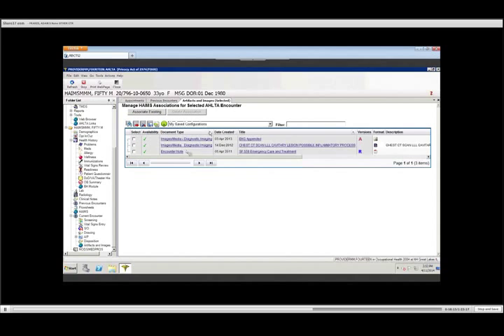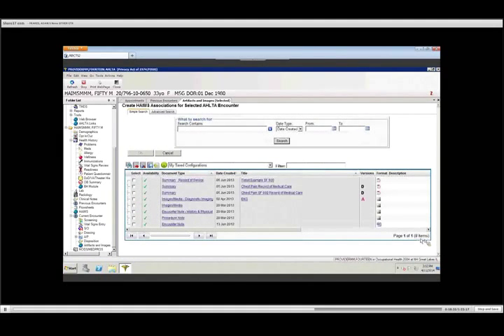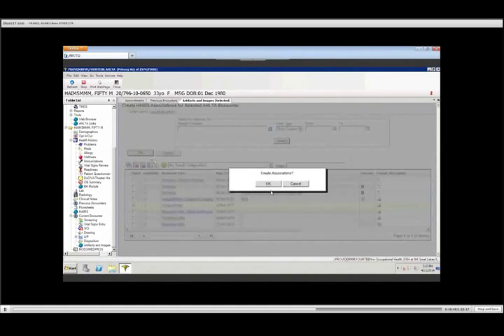So you'll notice we have 3. Again, the process is the same. I click on Associate. Now before I do this, we have 3 assets that are associated to this previous encounter. When I click on Associate to go and associate another one, do you recall how many assets I started with? I had 11. You'll notice down here on the right corner of the screen, it says 8. HAIMS is smart enough to know that it will not let you grab the same asset twice. So I could then choose a 4th, click OK, and click OK, and now there will be 4 assets associated to that previous encounter.